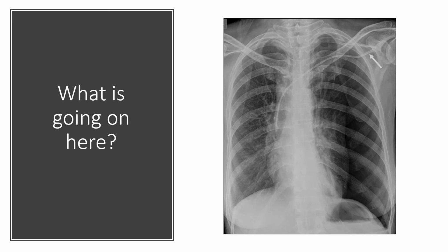Well, let's go through the A through I on it. All right, apices, I don't see any coin lesions. B is bases. I see a good CP angle. C, cardiac. Oh, well, I really don't see good moguls. That heart is tall and narrow. D, diaphragm. Let's count. 1, 2, 3, 4, 5, 6, 8, 9. Yeah, so good volume.